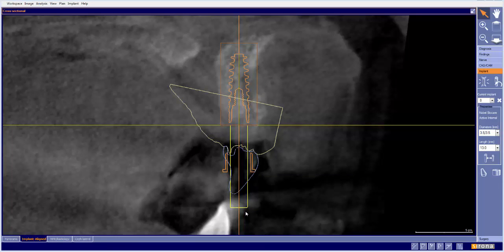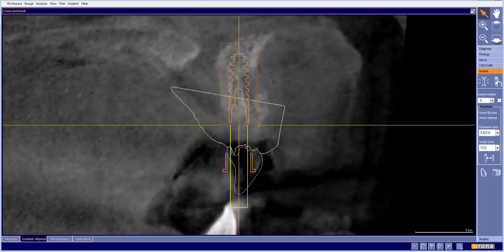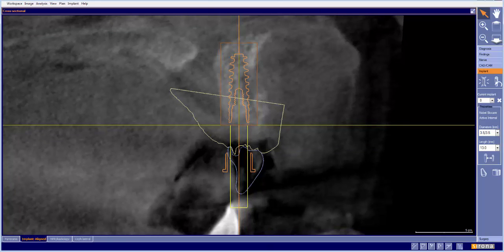The next thing is I'm still not screw retained here, so I'd like to go ahead and see if I can create screw retained. And now we're coming through the incisal edge. I'm not going to tip this much that way. I'm still after just trying to get the screw retained.